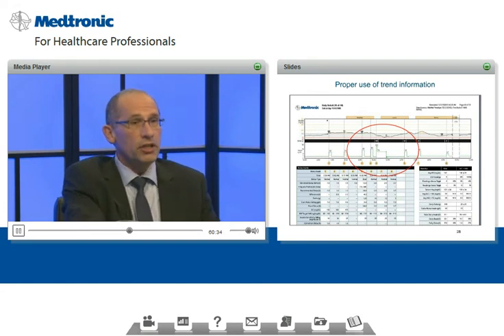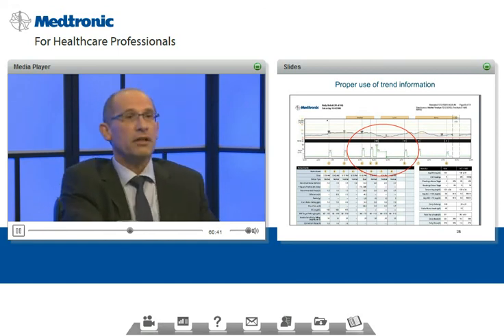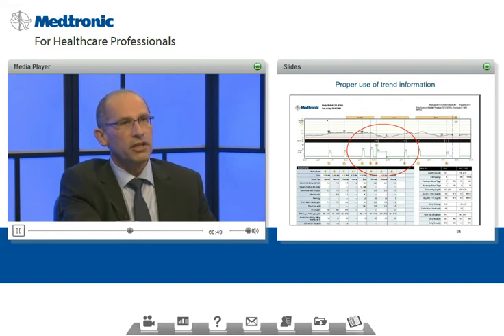And by decreasing the bolus recommendation by, in this case, 2 to 3 units, he avoided and prevented a hypoglycemic event. So it also shows us that in this case, the patient is intelligent in the way that he's using the data and using the pump and using the technology.